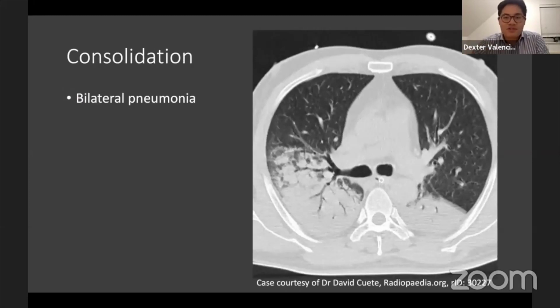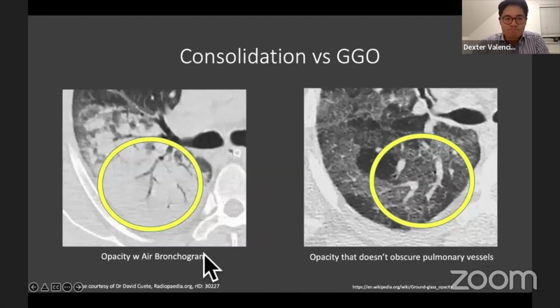And exactly when you do a CT scan, that's what you'll see. You'll see air bronchograms. So you'll see an opacity, which looks dense. So this is a CT scan axial slice in the lung window. Remember, everything else outside the lung looks white, but we've got nice detail. Here within the posterior parts of the right and left lung, we can see dense areas or high attenuation areas with these low attenuation linear air bronchograms. This is bilateral consolidation. So this is a patient with bilateral pneumonia.